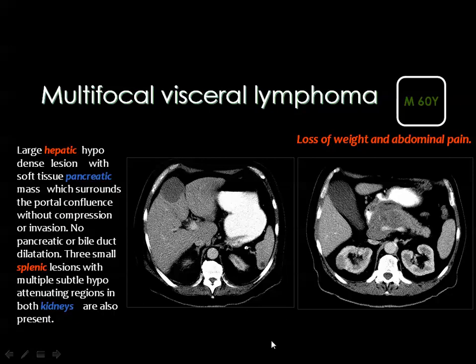And in the literature of splenic imaging, I will mention that the most common solid splenic focal lesion commonly seen in clinical practice is usually due to lymphoma. Then if you see a solid lesion or multiple lesions in the spleen, you may predict that this is lymphoma, and based on this diagnosis you can diagnose this focal lesion as lymphoma as well, and the mass in the pancreas as lymphoma, and also the mass in the kidney as lymphoma.